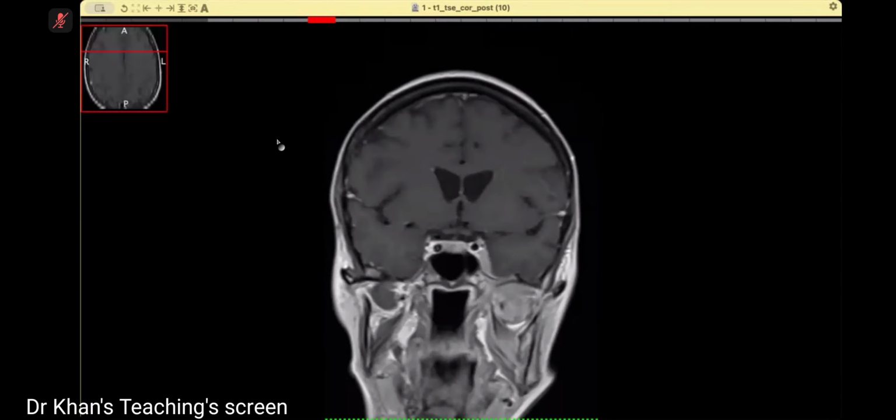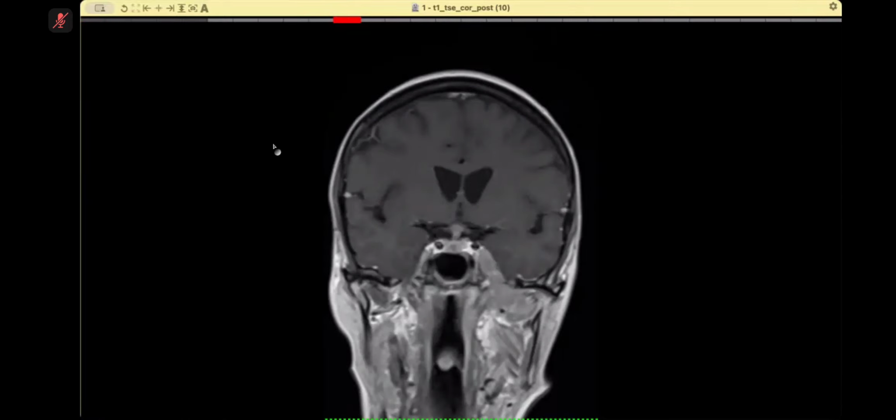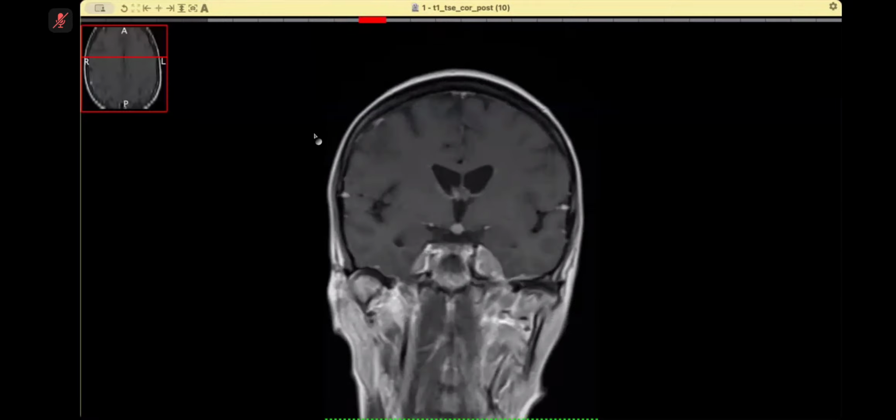as it is involving. I'm showing you a coronal now. Okay, so from here, I can appreciate that the lesion is traveling from the infratemporal fossa intracranially, and I think via foramen, likely foramen ovale, the trigeminal V3. It is traveling via the V3 into the Meckel's cave as well, and it is also involving the pituitary stalk and the infundibulum and the hypothalamus as well.